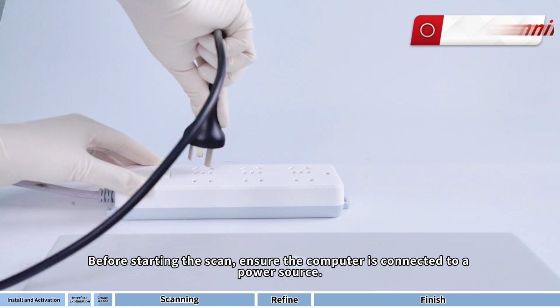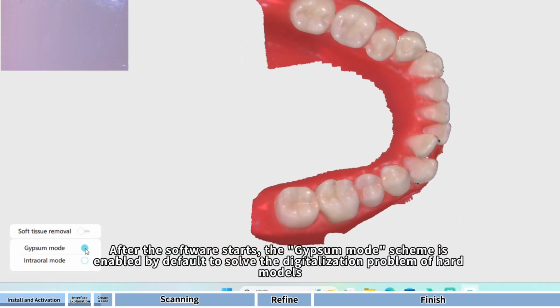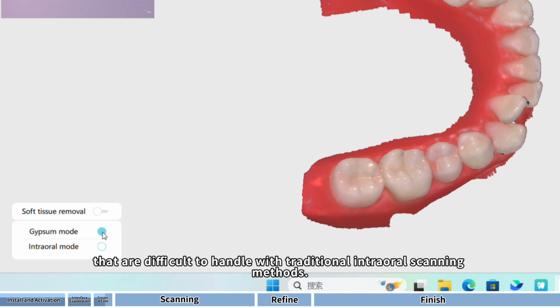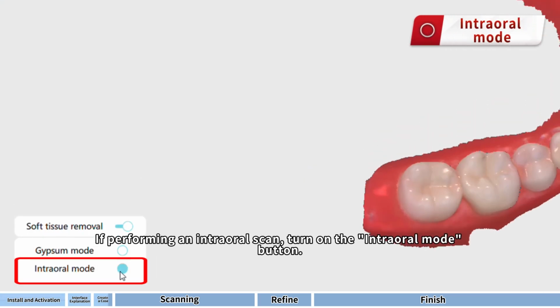Before starting the scan, ensure the computer is connected to a power source. After the software starts, the gypsum mode scheme is enabled by default to solve the digitalization problem of hard models that are difficult to handle with traditional intraoral scanning methods. If performing an intraoral scan, turn on the Intraoral mode button.